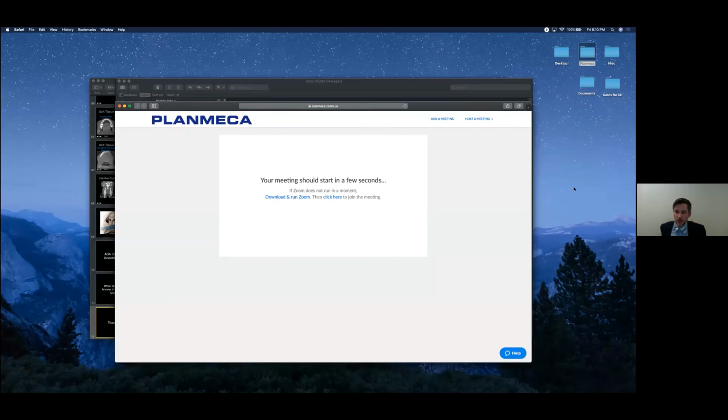That's the beauty of cone beam. You can see things in 3D that you just can't see in pans. So if the odontogenic sinusitis is asymptomatic, treat the tooth that needs to be treated, and then hopefully that'll resolve the issue.